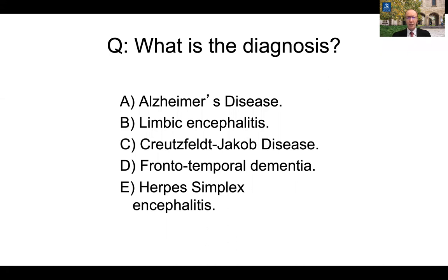What is the diagnosis? Alzheimer's disease, limbic encephalitis, Creutzfeldt-Jakob disease, frontotemporal dementia, or herpes simplex encephalitis. A few seconds to think about that.